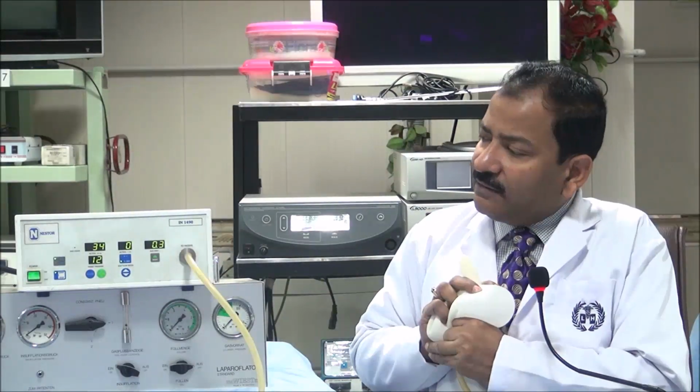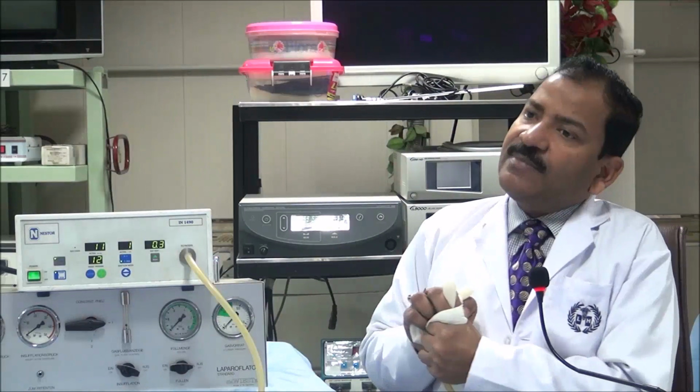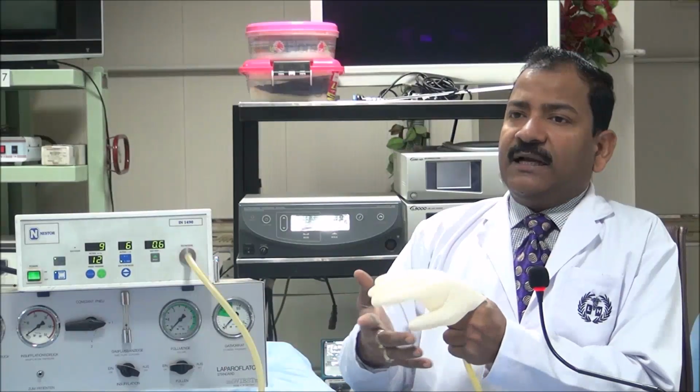If I press it from somewhere, like I am trying to press it here, the actual pressure increases. Then see, the actual pressure is how much? Then it will give me an alarm for 5 seconds, and after 5 seconds it will take the gas back. See, now it is taking back. So the insufflator is not only pushing the gas, it takes the gas back also. And if the pressure is released, again it will push the gas and bring it to 12. So if the pressure is less, it will push the gas. If the pressure is more, it will take the gas back.